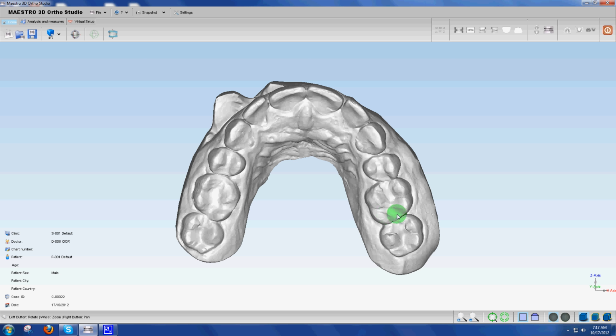I'm also going to define the first molar as the landing pad for the model marking area. When you have a sequence of nearly identical models, virtual or otherwise, it is going to be nearly impossible to tell them apart in the sequence, and model marking will be helpful in that regard.